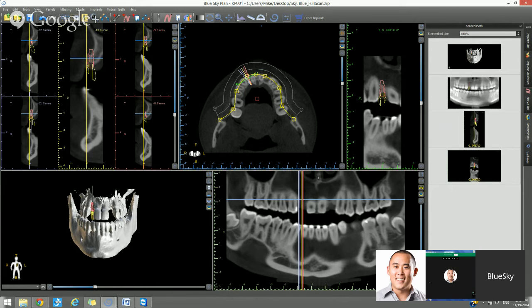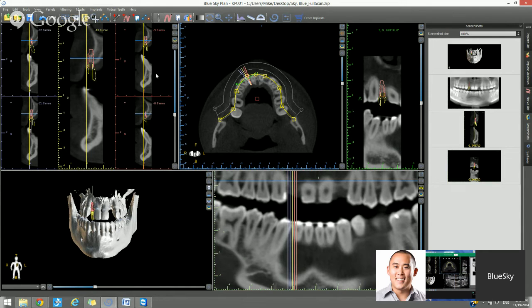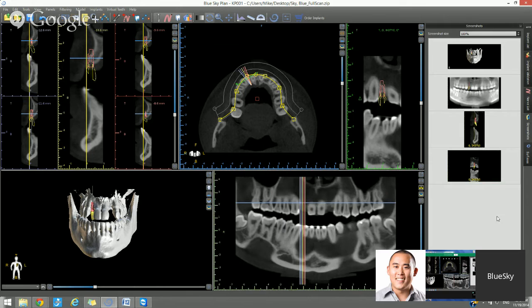The CT summary report was designed primarily for reviewing a CT scan, or if a scan center wants to create a report for the dentist, then you could press the CT summary report. It will go around the arch and it will add the cross-section slices. It will add the panoramic and some other popular slices in order to review the CT scan.